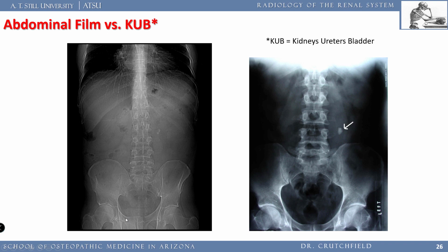And it will go way down past the pubic symphysis. So it'll show us everything. You can even see, this is a floating rib here, but the liver you can sort of make out right at the bottom of that floating rib. And if you look closely, you can see the kidney over here. I cannot see the left kidney, but I can see the right kidney right there.